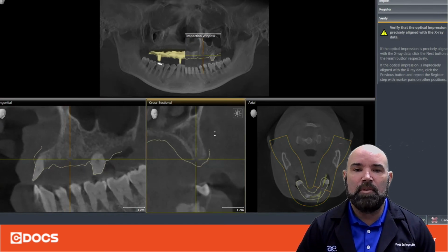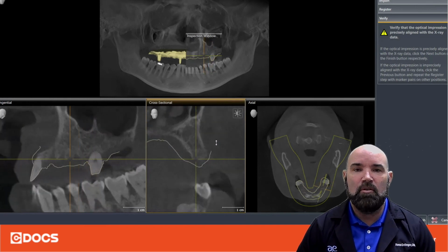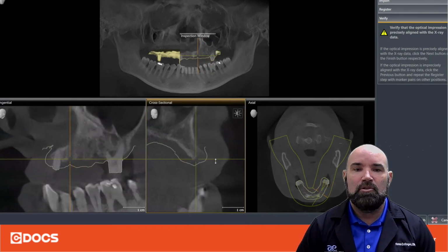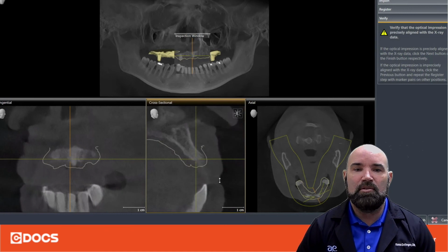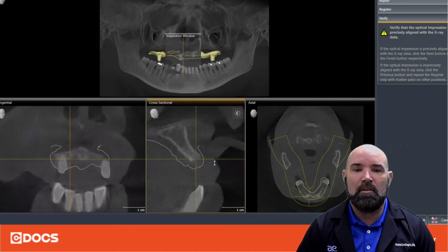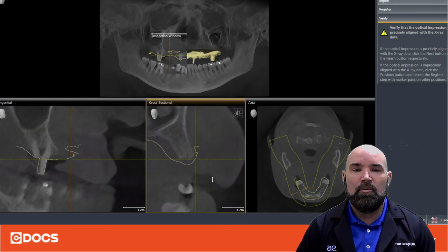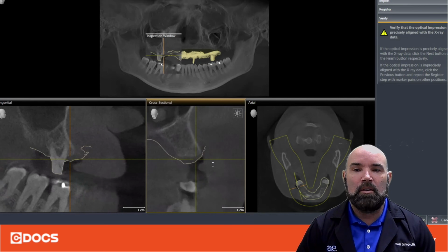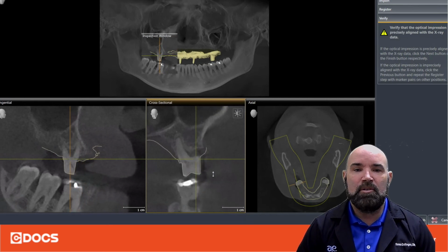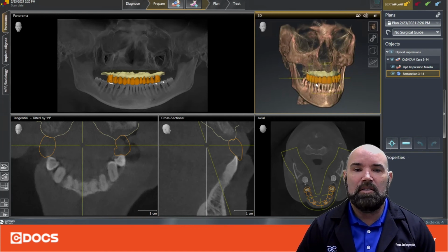And we'll notice that we have our prosthetic information now superimposed over our cone beam scan. So I'm just verifying at this stage that the stitch is completely accurate across the arch, and with Primescan we get that type of cross arch accuracy. Now we have brought in our prosthetic information. We can see our full arch bridge now superimposed over top of our CT data.